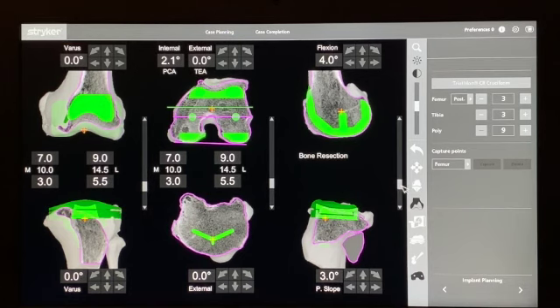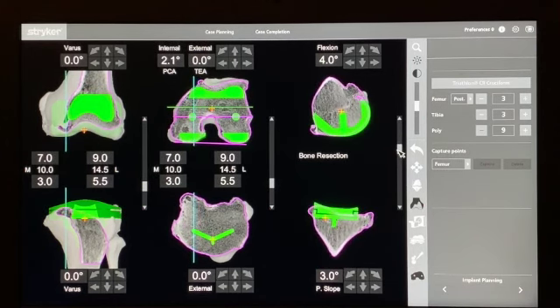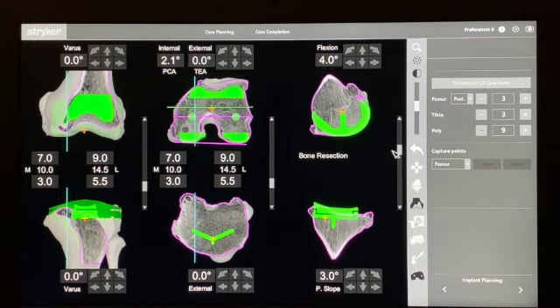When we look at the tibial component, there are different ways of planning your tibial component. Looking at the posterior slope, some people would set all patients to 3 degrees. Some people like to follow Scott Logan's theory and put all of them at 0 degrees. Some people vary between PS and CR inserts, and some people match the normal native bony anatomy. So for matching the anatomy of the tibial plateau on the medial side, we probably want to put a little bit more slope in here. You might want to dial this up to 4 or maybe even 5 degrees tibial slope. If you're someone who likes to stick at 3 degrees, that's very reasonable as well.